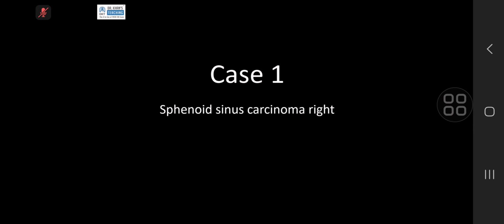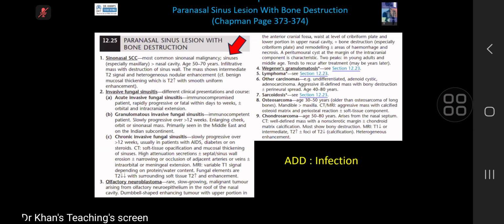Now, this was a squamous cell. Once you know what the epicenter is, then it becomes quite easy. I have selected these kinds of cases today, many of them, where findings are quite obvious, but the whole of the viva in the exam will be the grilling of anatomy. What is this? Where is it going? What is happening? That kind of thing.